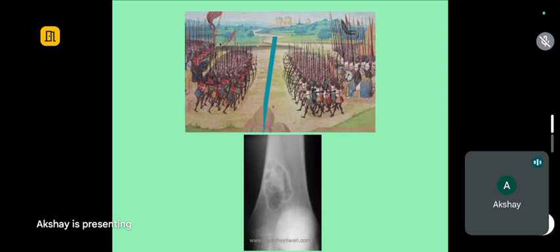So this is how a not so aggressive army will invade the home territory. They have invaded, but they are well contained with this wall. At the same time, we do not see.